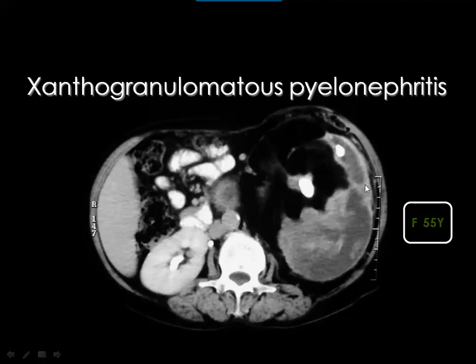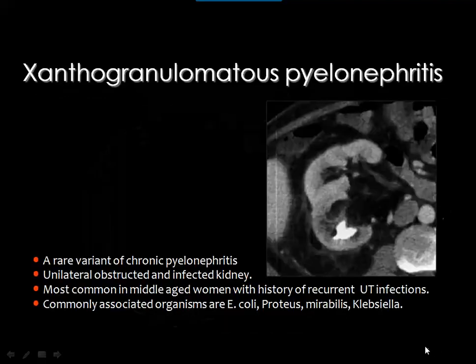This is a very good example of xanthogranulomatous pyelonephritis of the left kidney. You see the kidney is huge and not functioning. There are big calculi, and there is a good amount of fat replacing the renal parenchyma. Sometimes you cannot see this triad, which I mean the fat, the loss of function and the stone, but you may predict the appearance by the presence of two.